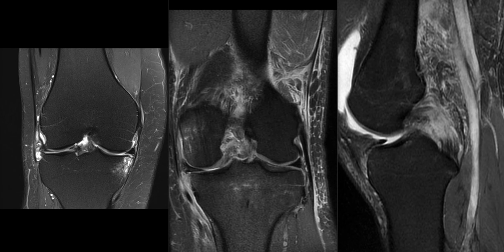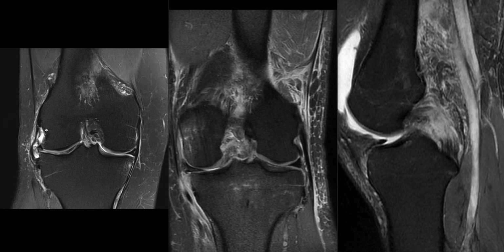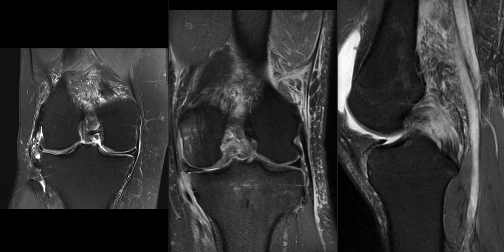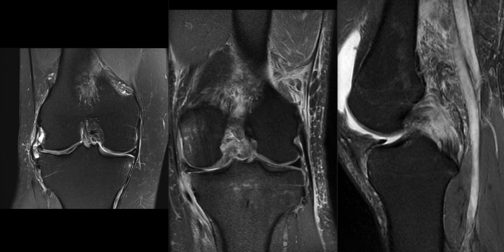In this patient, which is the other side, if we look for the same popliteus attachment, we see that in fact we have an empty fossa here, and there are fragments of the avulsed popliteus tendon extending down here. So this is a not uncommon association with posterior cruciate ligament injuries, and it's important to look for because it's an easy injury to overlook.